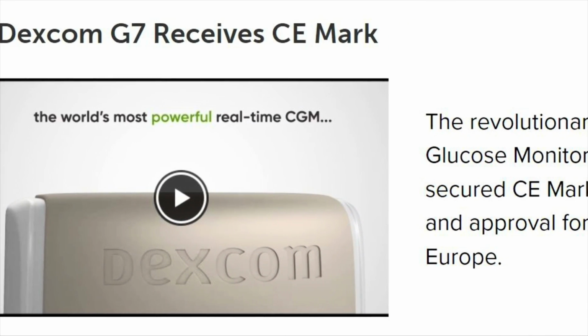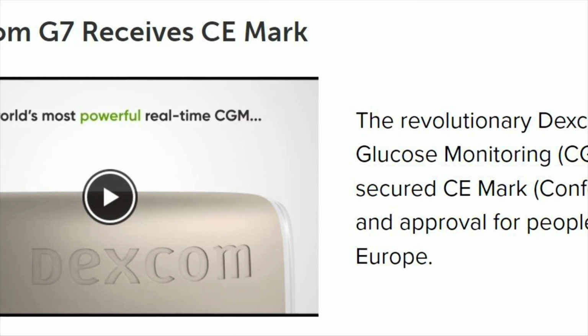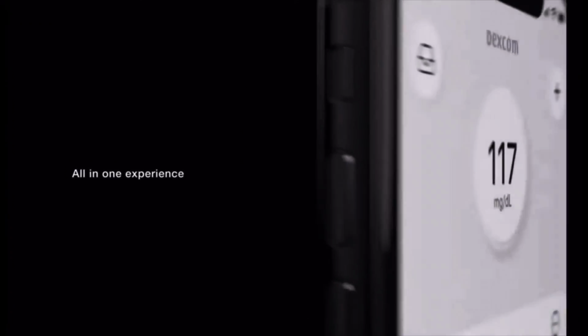All right, so the Dexcom G7, it's almost here. It's been CE marked in Europe, almost ready for FDA approval here in the United States, and most of the details are out about the G7, but there's been some new details about the new redesigned app for the Dexcom G7. So prior to this point, the only glimpse we had of the Dexcom G7 app was a small video clip that Dexcom released, but today I'm going to bring you all of the new information about the completely redesigned Dexcom G7 app, and there's a bunch that's new about this app. So let's break it down. Let's talk about the brand new, completely redesigned Dexcom G7 app.